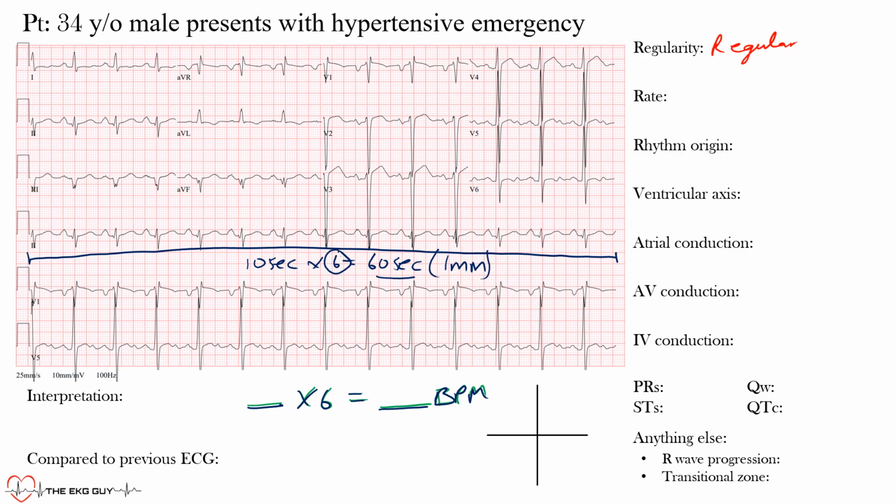In this case, we'll find the ventricular rate by counting these QRS complexes, or you could do the T waves. So we do one here, 1, 2, 3, 4, 5, 6, 7, 8, 9, 10, 11, 12, 13, 14. From that you want to do 14 times 6. We should do our math, so let's just do it here. 14 times 6 is 84 beats per minute. Hopefully I did that correctly.